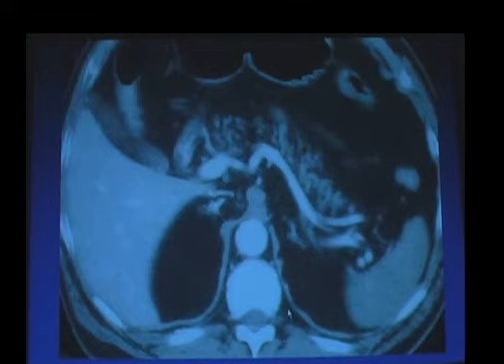So this is a patient who became hypotensive. This patient had actually been resuscitated a couple of times in the emergency room. You can see the globally decreased spleen size and the decreased enhancement of the spleen. Normally the spleen is going to enhance at least as much and slightly usually greater than the liver. You can also see the slit-like appearance of the inferior vena cava.